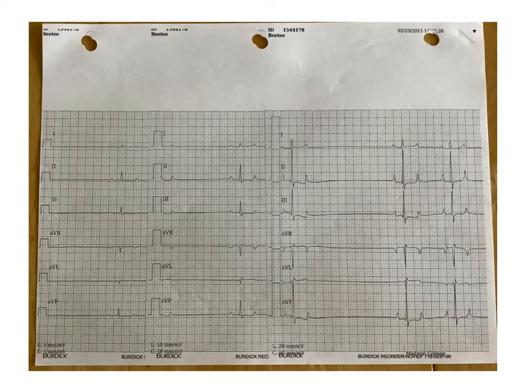On this strip, I wanted to talk to you guys about calibration. This is that other machine setting we work with. This is all, again, BT, and I took his ECG at 3 different calibrations. This was at 5 millimeters per millivolt. Starting here, I changed it to 10 millimeters per millivolt, and lastly to 20 millimeters per millivolt.